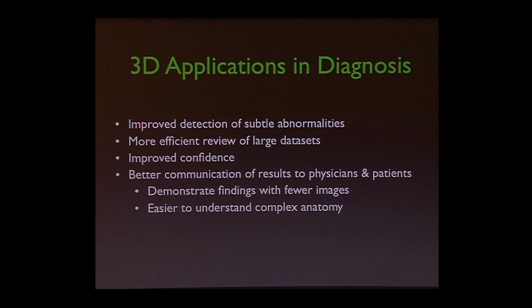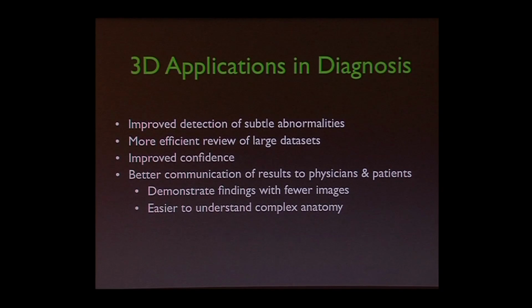And I think it does increase our ability to recognize and perceive subtle abnormalities, even above their source images. They're all on the source images, but we can better appreciate them when we see them in 3D. And so I'm just giving you the tools of a radiology detective. We'll get into some cases and demonstrate this for you in a little bit. And we can, as I said, more efficiently go through large data sets. I'll demonstrate this in a few minutes as well.